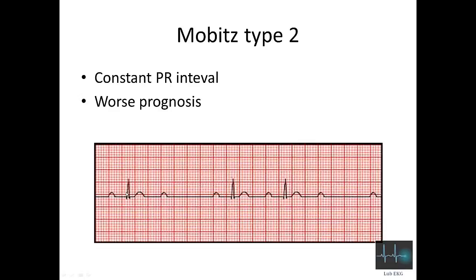And do you think you could fit a picture of Dr. Wenckebach in here? No chance, no chance. It's just not big enough. This is type 2. You would never fit it.